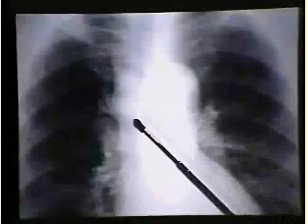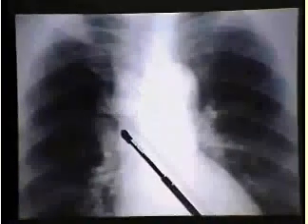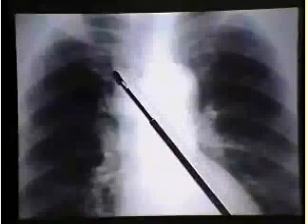Now, here's a patient whose plain film of the chest suggests a mediastinal abnormality on the right side. If we look at the shadow of the tracheal air column and the contour where it goes into the right upper lobe bronchus, instead of having a parallel line for the superior vena cava, we have some kind of convexity over here. Now, the azygos vein may be large and convex, but this is much too irregular and too far lateral for that structure. So let's look at what we have on a CT scan.